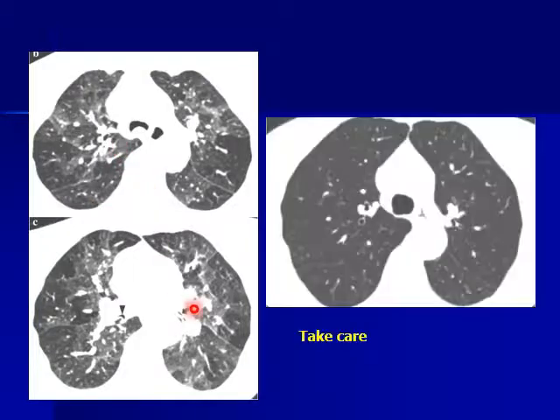Can you look at this lung and this? It looks as if there are ground glass opacities. Am I right? Easy. Opacities, and I can see vessels through them. This patient was repeated. There is disappearance of the ground glass opacities.